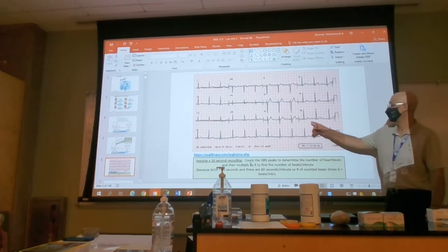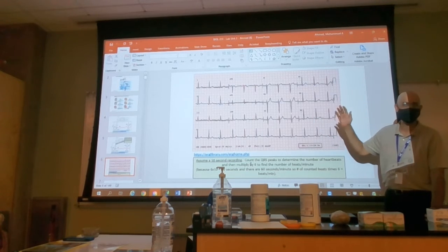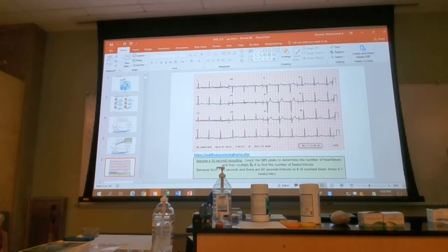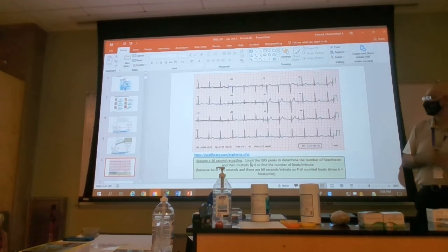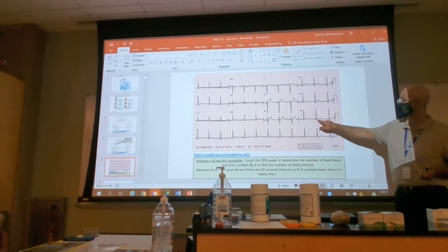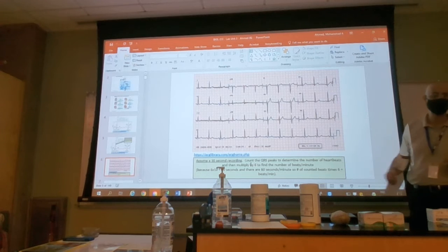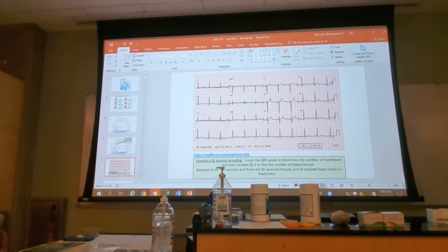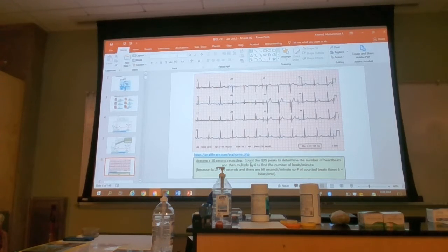Most probably you just simply get, let's say, the ST segment, and you should be able to identify it, and then the next part would be what is the definition of it, right? What does it represent? Basically the ventricular contraction part. And anyone who has, like I said, myocardial infarction, when they go to the hospital because of the pain, angina, the doctor basically is looking at this portion. They're looking at whether the ST segment is elevated or depressed, and they are able to tell the person actually had a heart attack, right, guys? That's what they're looking at. So yeah, that's one thing.